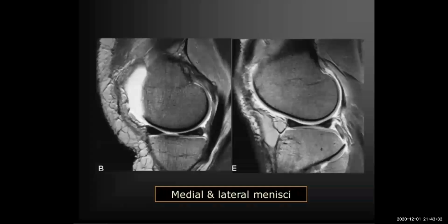This is a slide just to compare the medial and the lateral. Again, how do I know whether the study starts from the medial or lateral? Let us rehearse it together. The fibula should be somewhere here. The shape of the tibia is different: here it is like a hockey stick, while here it is like an ice cream cone. Then we go for the meniscus.